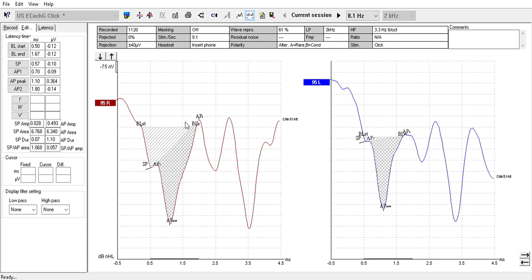So it's shading in the sections between all of this here versus this part here, and so it's taking this cross-section overlap to see how large was the area of that section, and it's giving a calculation based off of that. And so we'll see, we've got a pretty large area here compared to this one here, and so it's calculating the area that's shaded in that space. And so that's how that calculation is made. Again, there's a lot more math to that, but just kind of the simple version of what we're looking at. And this is normal for both ears for both of these patients that we're seeing.